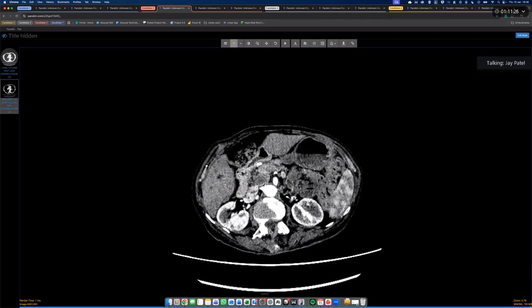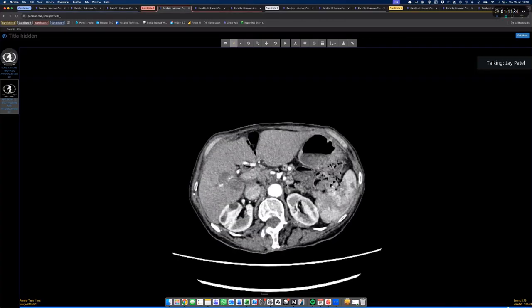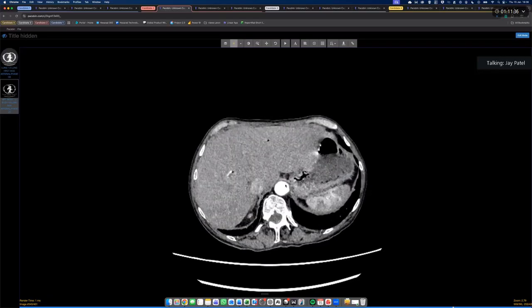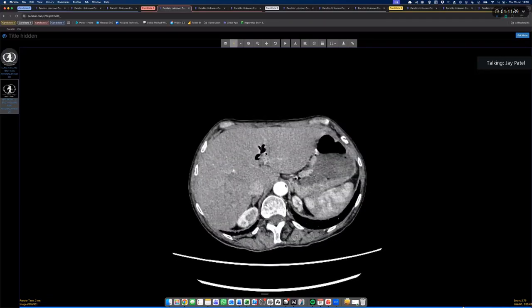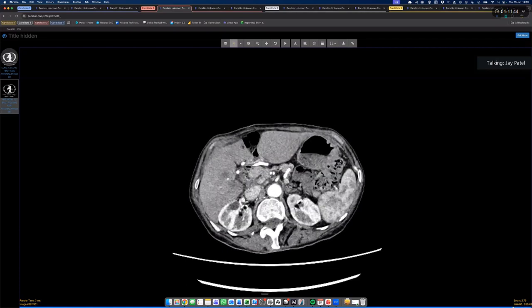So a summary for a case like that would be, this is a thoracic CT of a patient with extensive emphysema, and supradiaphragmatic lymphadenopathy with an abnormal lesion within the right lobe of the liver and portal vein thrombosis. I suspect there may be a malignant underlying cause, and I'd recommend a portal venous scan through the abdomen and pelvis, and following that, review of this scan, potentially a referral to a relevant MDT. That's what I would say. Your point about prior imaging is very helpful as well.